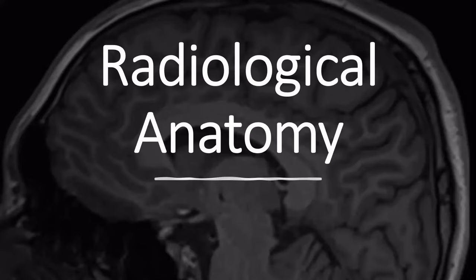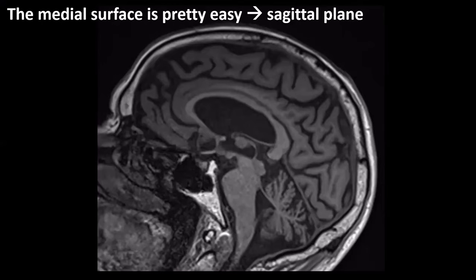Now, let's move on to radiological anatomy. So I started with discussing general anatomy because you just have to know your anatomy before you can translate your anatomical knowledge to radiology and recognize these structures on radiological images. Let's start with the medial surface because the medial surface is actually quite easy on images. This is a sagittal T1 weighted image, and we can recognize all the landmarks we saw on an anatomical specimen.